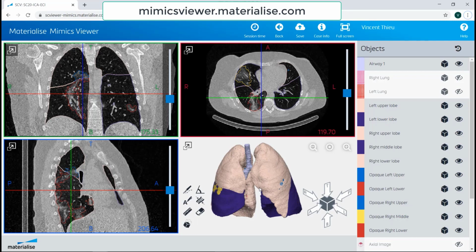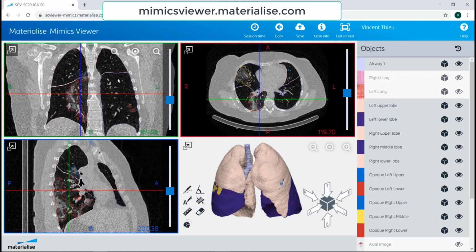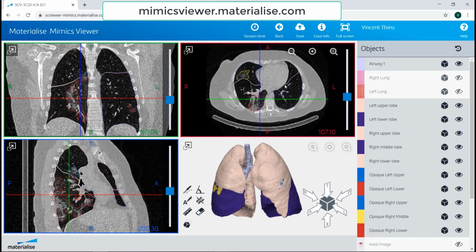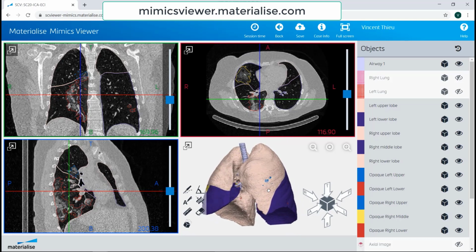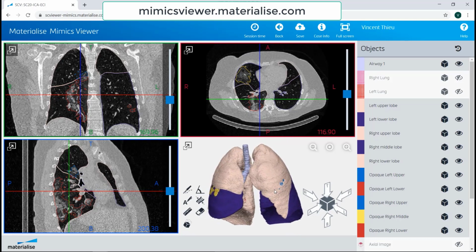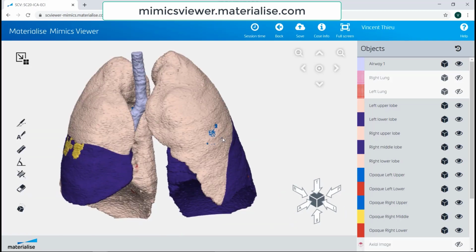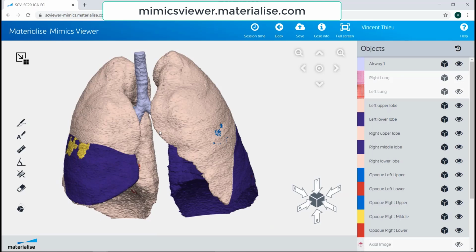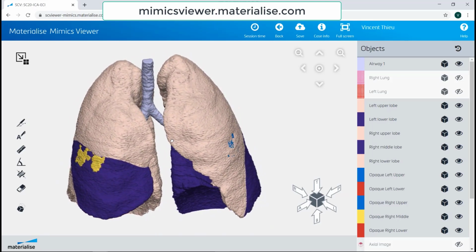This case comes from the CT of a confirmed COVID-19 patient. You can see the sagittal view of the CT scans, coronal view, axial view, and 3D object view. To maximize the 3D object view, you can use the spacebar, and now you can see the 3D model of a patient's 5 lung lobes with abnormalities caused by the inflammation effects of COVID-19.